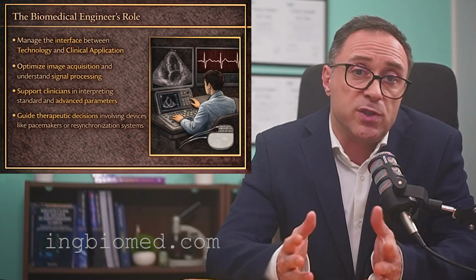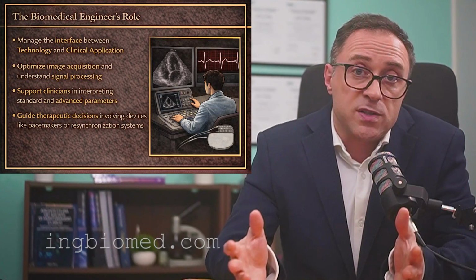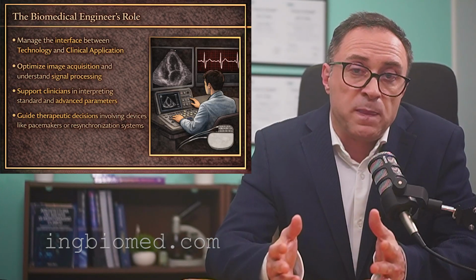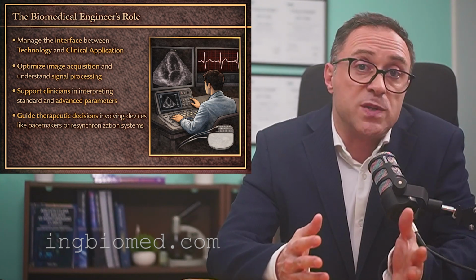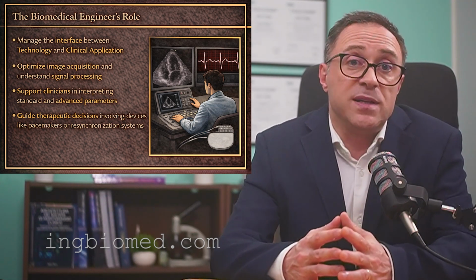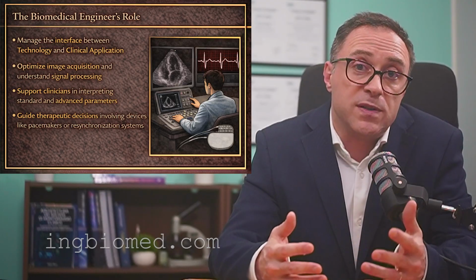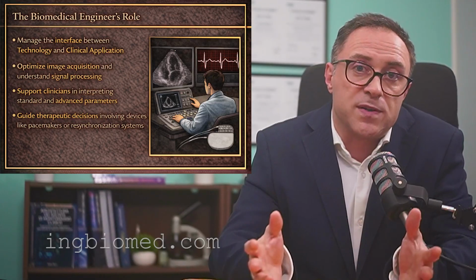From my perspective as a biomedical engineer, my role is to manage this interface between technology and clinical application. I focus on optimizing image acquisition, understanding the underlying signal processing, and supporting the clinician in interpreting both standard and advanced parameters.